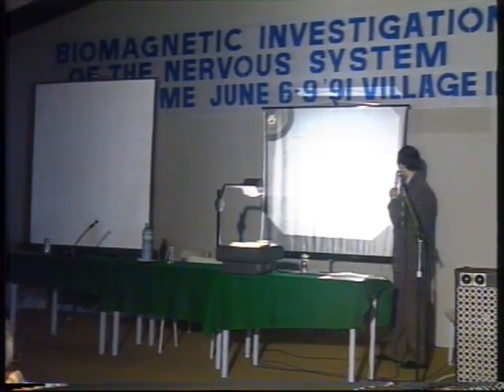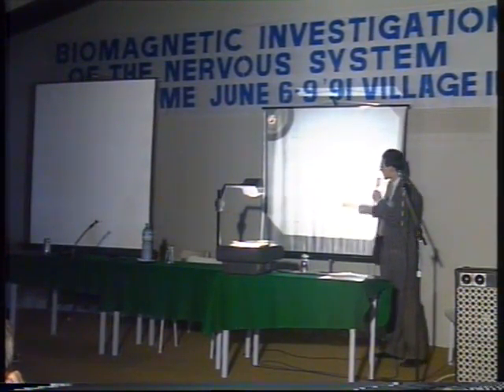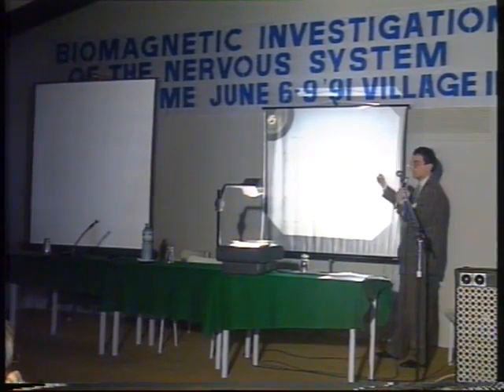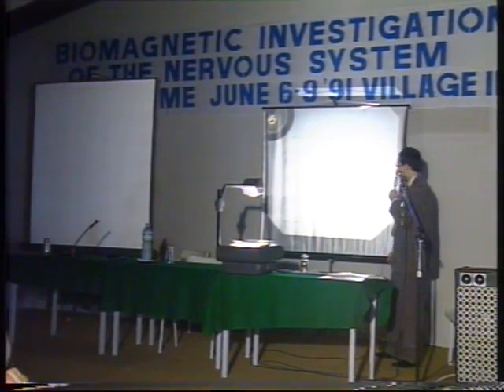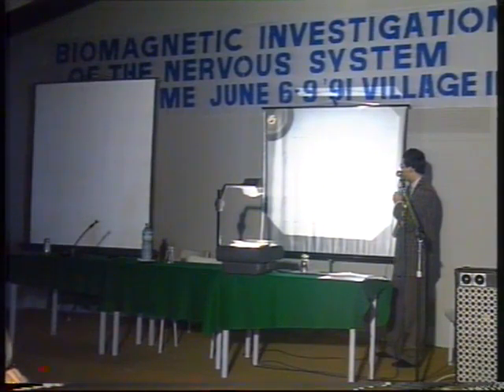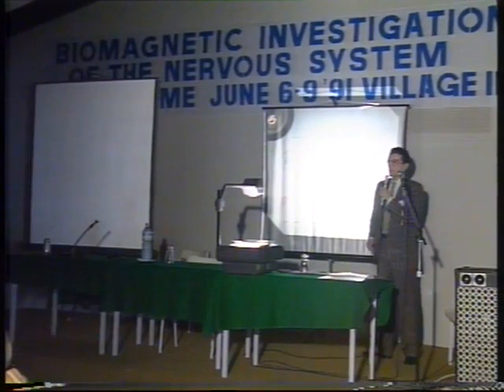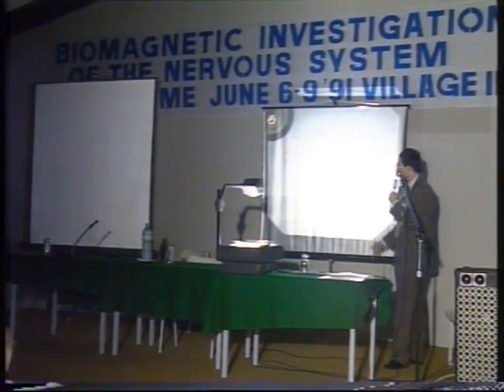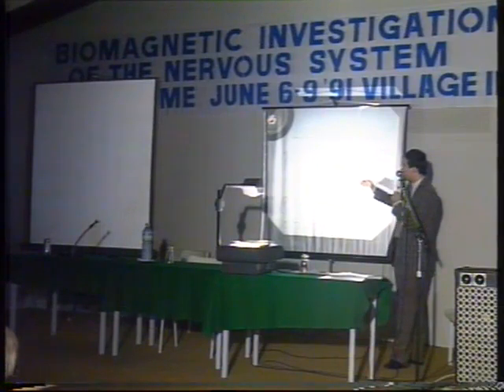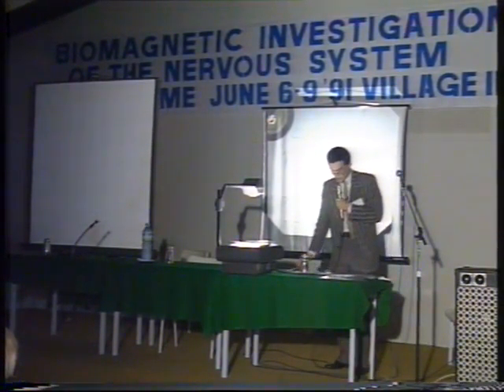24, 25, 26, 27, and you can see here it seems like something is coming on in a very posterior region about 28 milliseconds after, and it's not really a dipolar shape, so we cannot talk about real source localization there, but there are some hints of a different brain site which is being activated now.